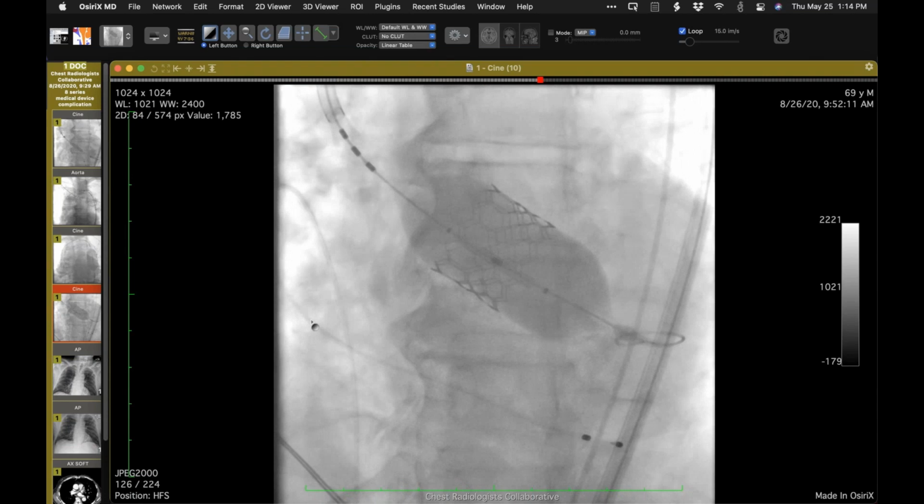So by way of background, here you can see during the procedure on these images that there is this right ventricular pacing lead. The way they do this during the procedure, in order to avoid this issue, is they use this right ventricular pacemaker lead to pace the right ventricle rapidly. So there's rapid right ventricular pacing. And they achieve a quick heart rate and a drop in blood pressure and stroke volume ejection during the deployment of the balloon.